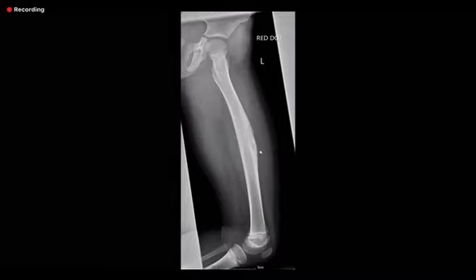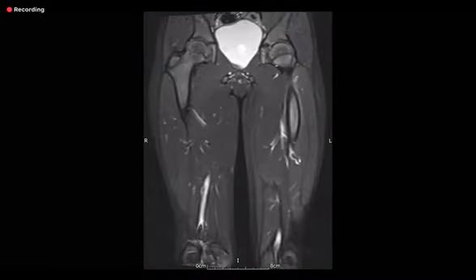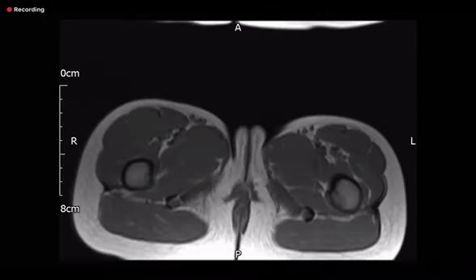Now, what is happening here is, if you see this bone here, this is sequestrum, this is dead bone, and this is a key finding. And so there is a breach here, cortical tunneling is here. So on a plain film, I'm expecting you to pick this up and say that this is osteomyelitis, chronic type of osteomyelitis. And then the axial sequences are very, very good.